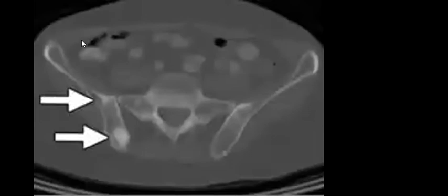Hiba? Yeah, because you asked the question, so this is the answer to your question. The answer is the reverse is true, because the PET-CT sometimes cannot detect all the lesions and it could be metastasis. So not every hotspot is cancer and the reverse is true.